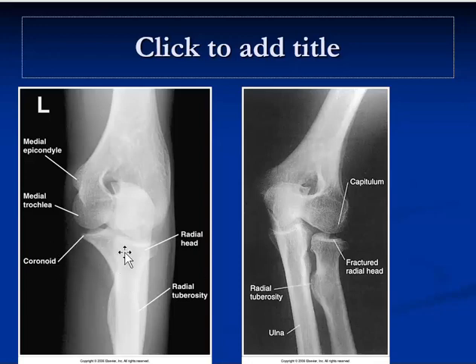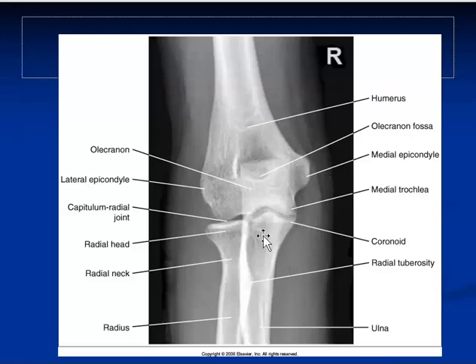If we have medial rotation, then this is extreme. This is truly an oblique of the elbow, so this would be with the hand pronated. But if you were to internally rotate, which is more common of the positioning errors, you position the patient truly for an AP of the forearm, AP of the elbow, and you disappear behind the control panel and the patient starts to relax, they're naturally going to internally rotate. And what that's going to give you is an increase in superimposition on the proximal, especially the radial head and the radial tuberosity.